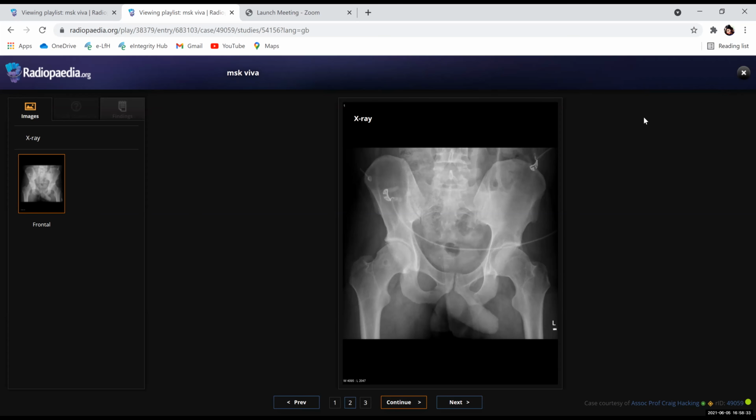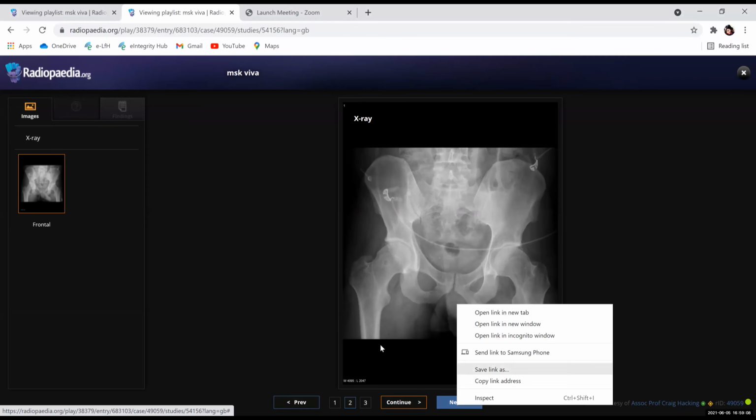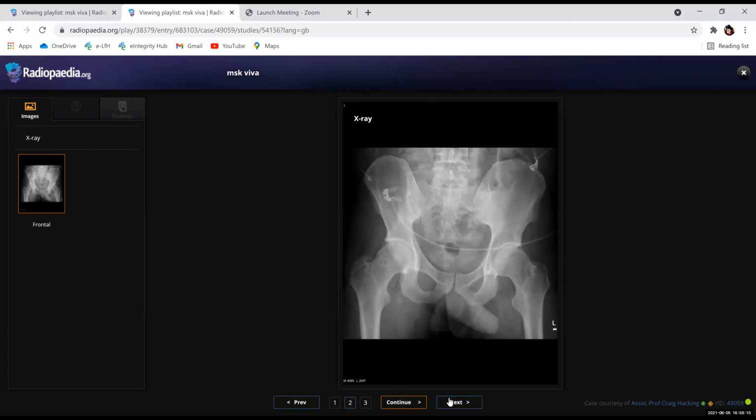So I'm looking for any fractures or any dislocations, the superior pubic ramus and femoral neck region. So this lesion could be a benign lesion like a synovial pit, or it can be a bone island, but a bone island will be a dense lesion. So I'll compare the previous images, and if it is stable, then this could be a benign synovial pit or something. I don't remember the exact name. Yeah. Pit.